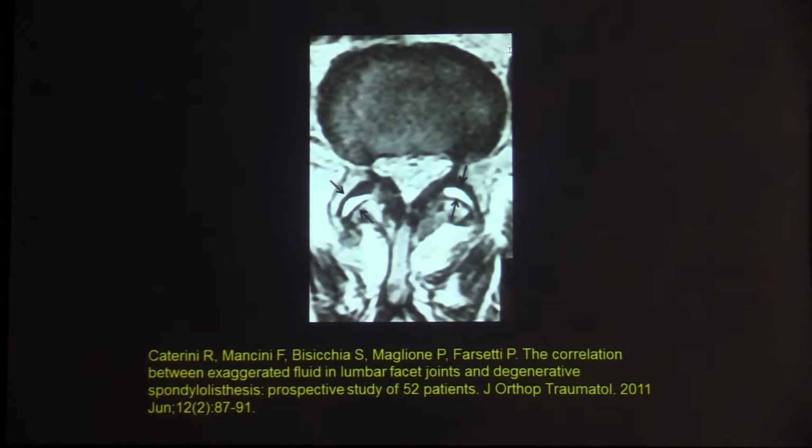So now we get to this facet joint here. If you look at this facet joint, you say there's some arthritis here, and some joint effusion, but where is the joint space narrowing? To me, this is a paradoxically wide joint. So why is this joint wide?